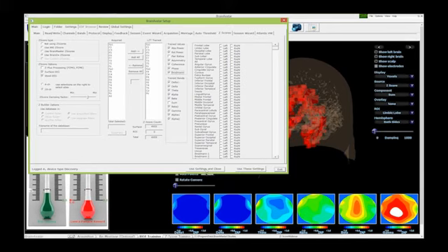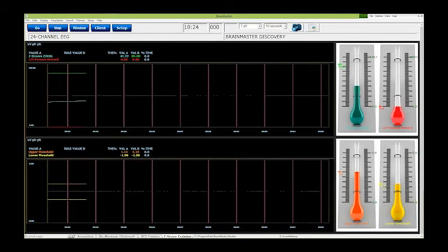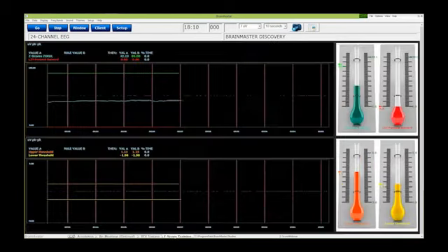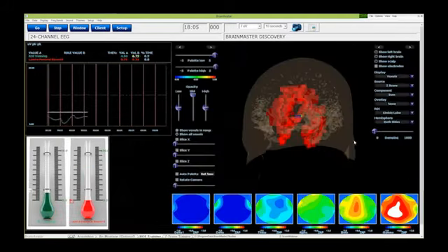The only time you can't do something like that is you can't really view a map, or you can't really view Z-score numbers that you have checked off. So, for example, on this one right here, if we go to our Z-score Monitor page, you're going to notice that some band is nowhere here anywhere. That's because we aren't training it. That is the reason. So, yes, with Voxel EEG, you can view different things that might be checked off in different areas. Okay?